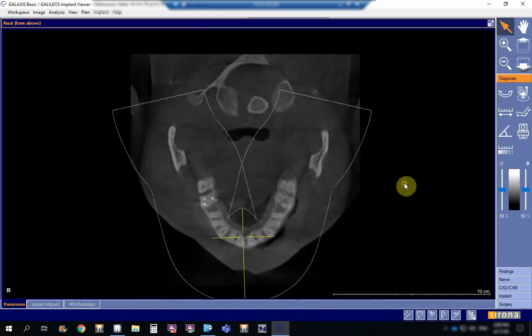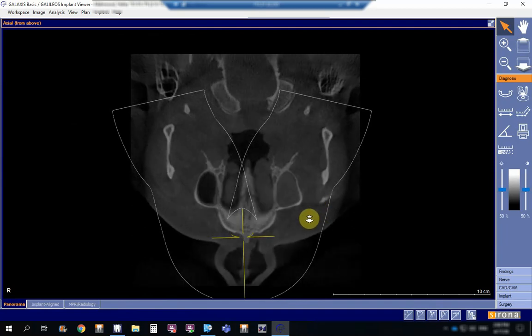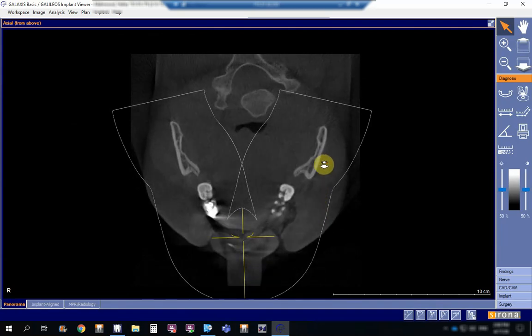I will just maximize this so that we will get orientation, because it needs a bit of imagination so that you can know what we're going through. Okay. Let's have a reference here. Our reference here is, can you see this? I will just drag this away.